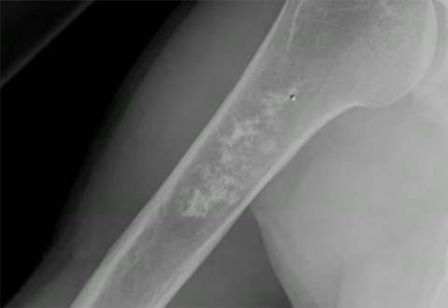Again, the margins are somewhat irregular because what we're mainly seeing is the matrix. Superiorly, one can see pretty normal bone above this. Inferiorly, there's a little bit of lucency here that's subtle to detect. In addition, we don't see any periosteal reaction along the surface of the bone, a nice smooth cortical margin here, and we don't appreciate any soft tissue mass within the soft tissues.